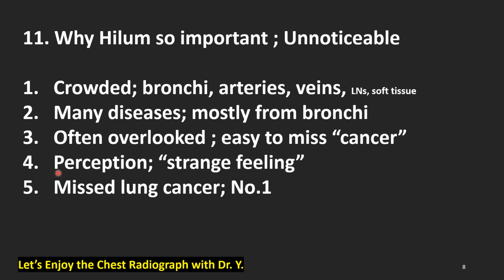And hilum as important is perception. When you feel something strange at the hilum, then we should focus on the hilum once again. And number 5, missed lung cancer. Hilum is the number one place of missed lung cancer.